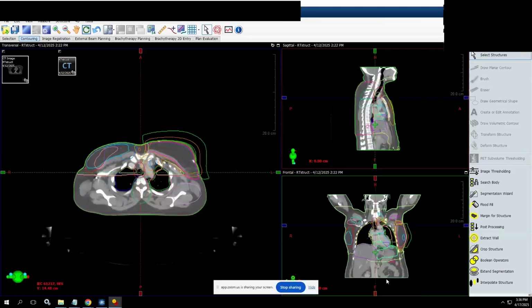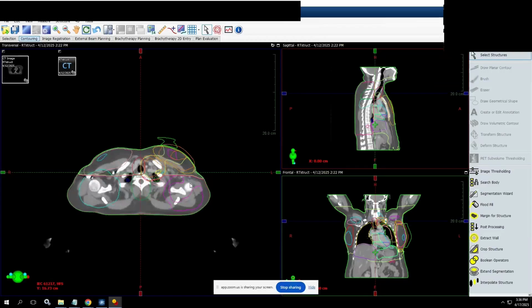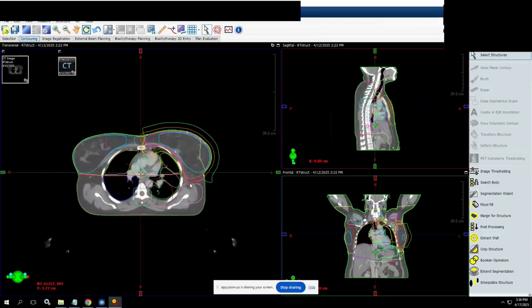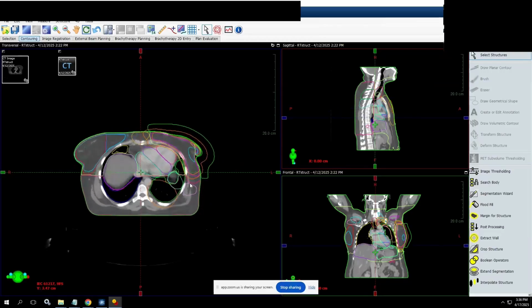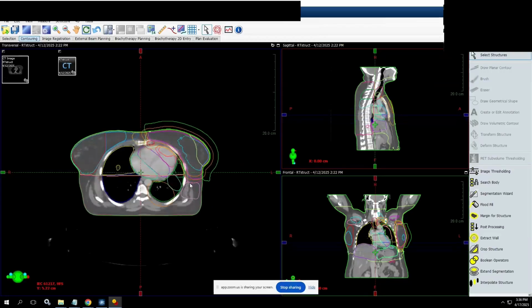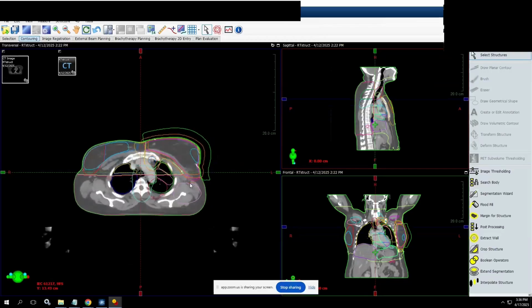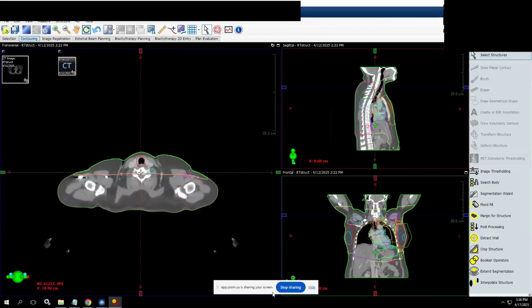One of the last segments that we wanted to demonstrate, and this would be quick, is planning structures. Now our physics planning structure drawing is often quite complex in order to meet the OAR constraints for breast, and all of these substructures that you are seeing have been drawn by the DRAW system. So if your physics planning system utilizes a very formalized way of segmentation of structures, we can help with generating a model for generating your substructures.